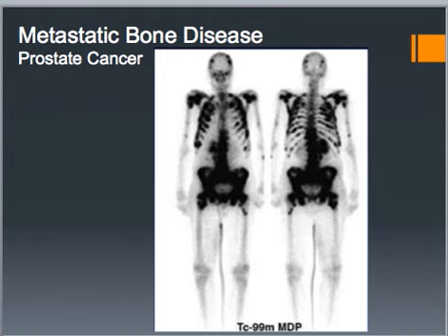Same with this one. This patient started out with prostate cancer, and they did the bone scan to rule out Mets, and I mean, it's just awful. It's attacked his entire body. I mean, it's all over in his brain. There's 1, 2, 3, 4, 5, 6 spots, all throughout almost the entire spine, especially when you get to the lower one. It's attacked his entire pelvis, hips, all the ribs, shoulders, in the abdomen. I mean, this patient is probably not even walking. You can tell this patient has a catheter. You can see as the radiopharmaceuticals are actually draining out the catheter between their legs. So this patient's probably in pretty poor condition.